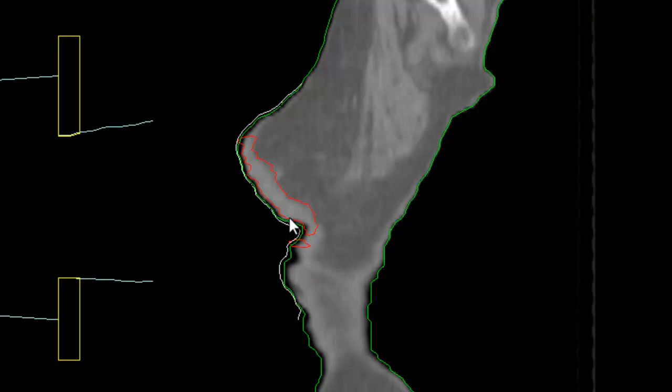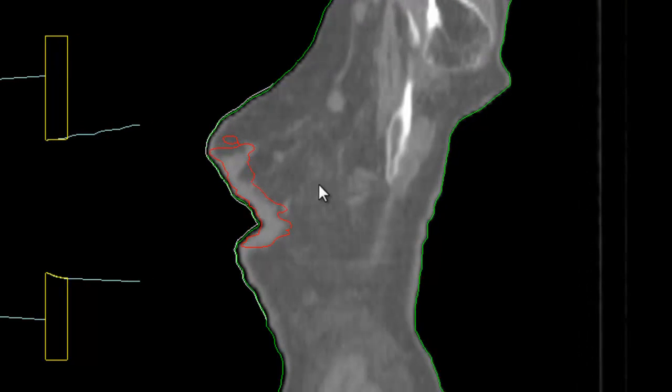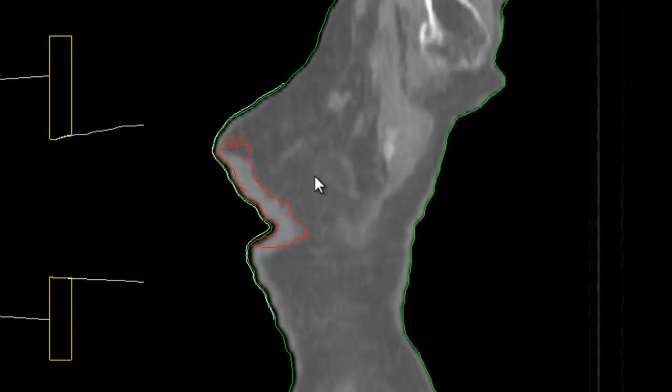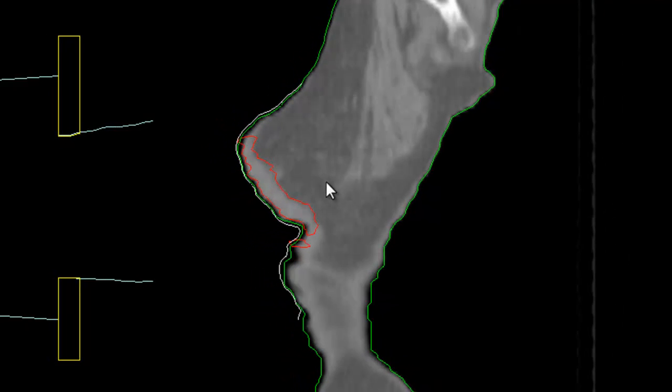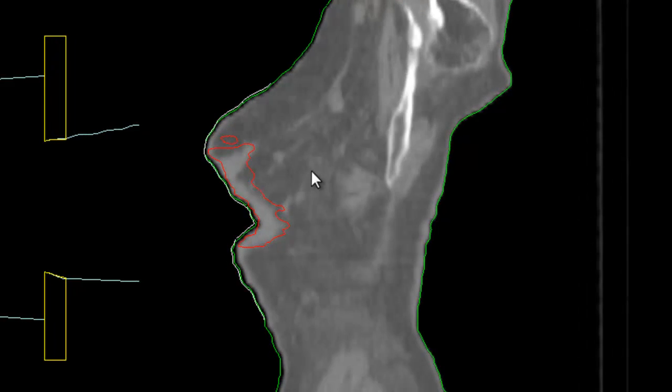So it takes a lot of the variation across contours out of our patient bolus surface design. So the rolling ball smoothing on a chest wall case can be a very good option to help eliminate some of those variations along the contours.